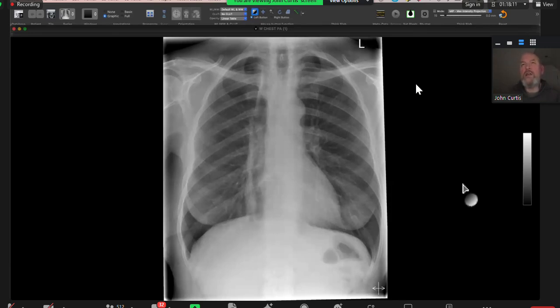Why do you think it's a dilated esophagus? Given the patient's history of dysphagia, I can see the linear lucency band, which is tracking all the way down towards the stomach region. Just show me with your mouse. So here, I'm going all the way down, and I suspect it could be an esophagus.